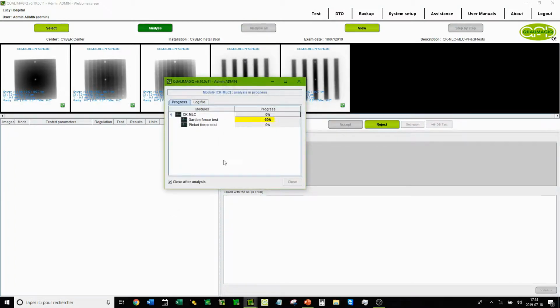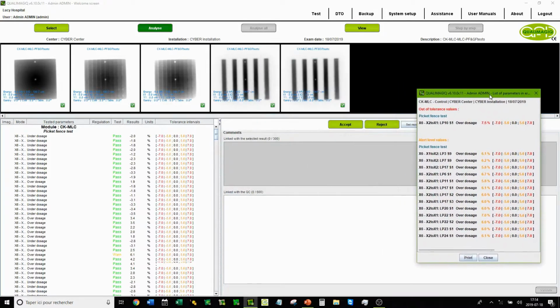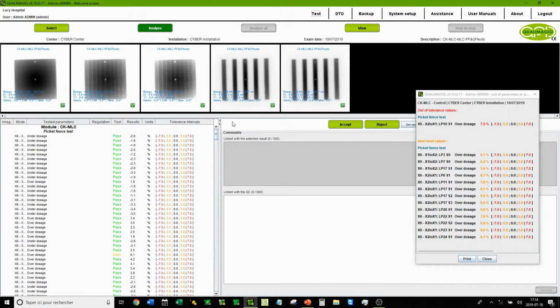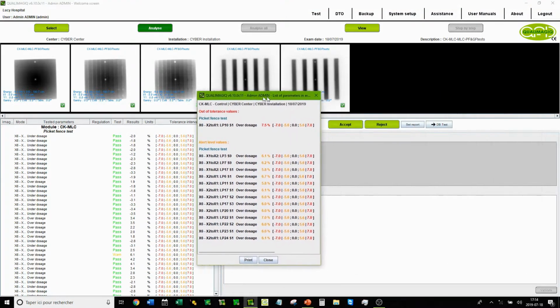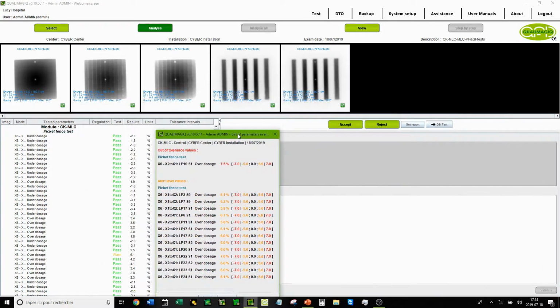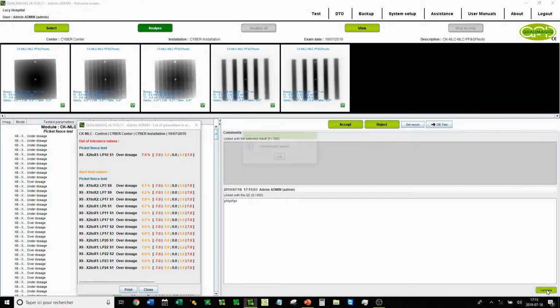The 2 tests are launched, and of course, as always, here we see a screen with all of the tests, and this other screen showing only tests with problems. Tests outside tolerance. Shown here is a picket fence test in which the MLC moves from X2 to X1 with values in alert status. The next step will be to comment this quality control and then validate the comments.